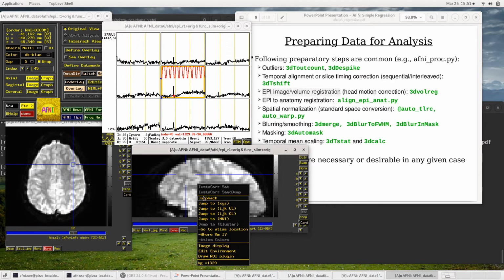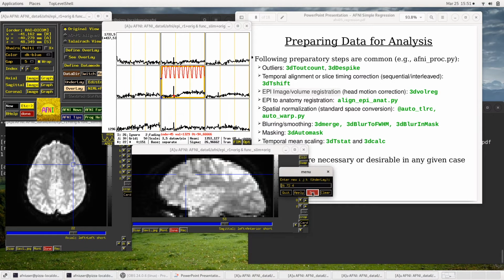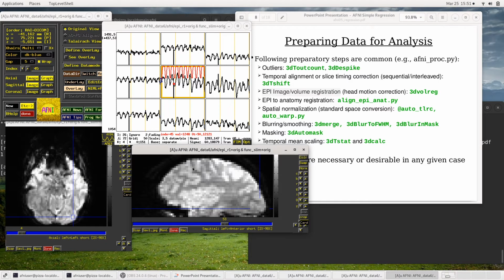I'm going to jump back. Let me jump to IJK again. We'll go back to where we were. So you want, of course, the whole time series to be for one location in the brain, across one run or across all the runs you're analyzing at once.